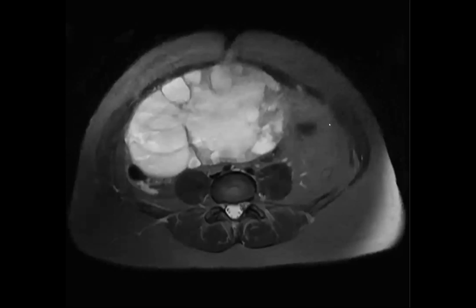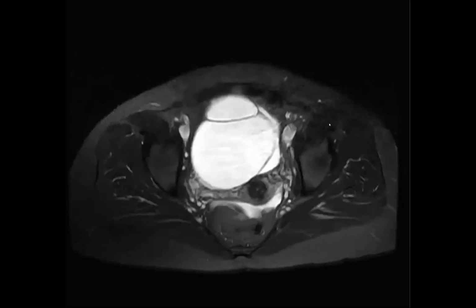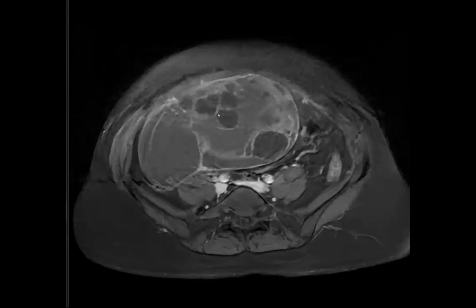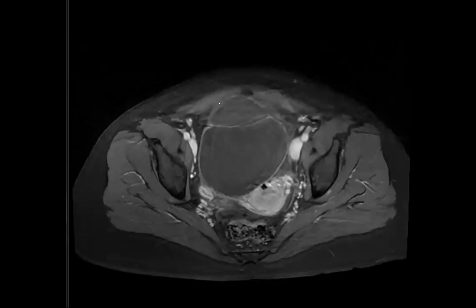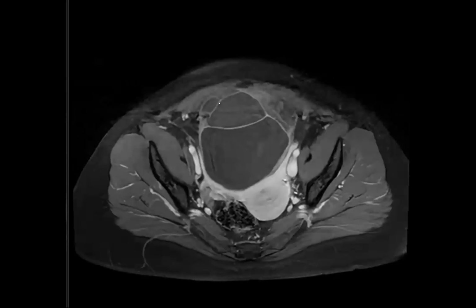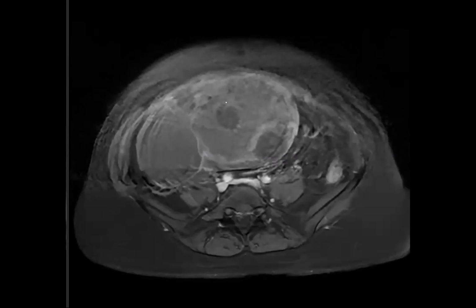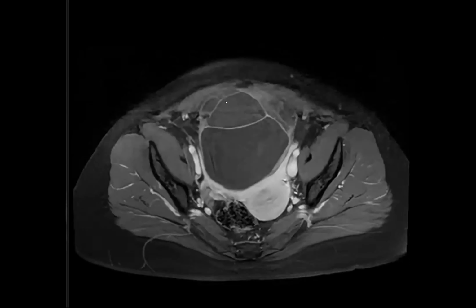And when I looked up ovarian hydatid, very rare, but they do happen and look very similar to this. So unfortunately, for the patient, this is where the exciting case would not benefit the patient. This was a borderline mucinous neoplasm, not the fun hydatid cyst.